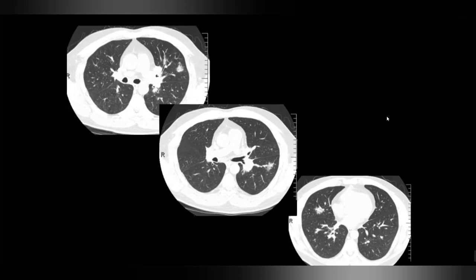And I would like to see the mediastinal window to further evaluate the left hilar enlargement. There was lymph node enlargement there. So since there was lymph node enlargement, I would still stick to the differentials.